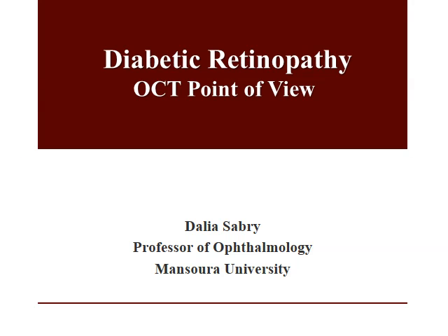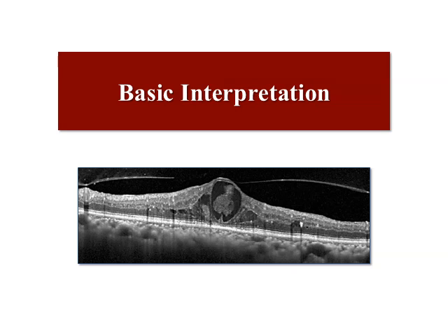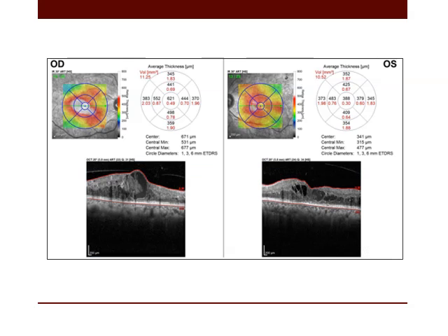Bismillahirrahman. Diabetic retinopathy, OCT. Basic interpretation of patient include a very important macular scan, the volumetric macular scan. Why is this scan important? Because it gives you information about the macular thickness and volume. Both values are very important in follow-up of disease progression and follow-up of the therapy.